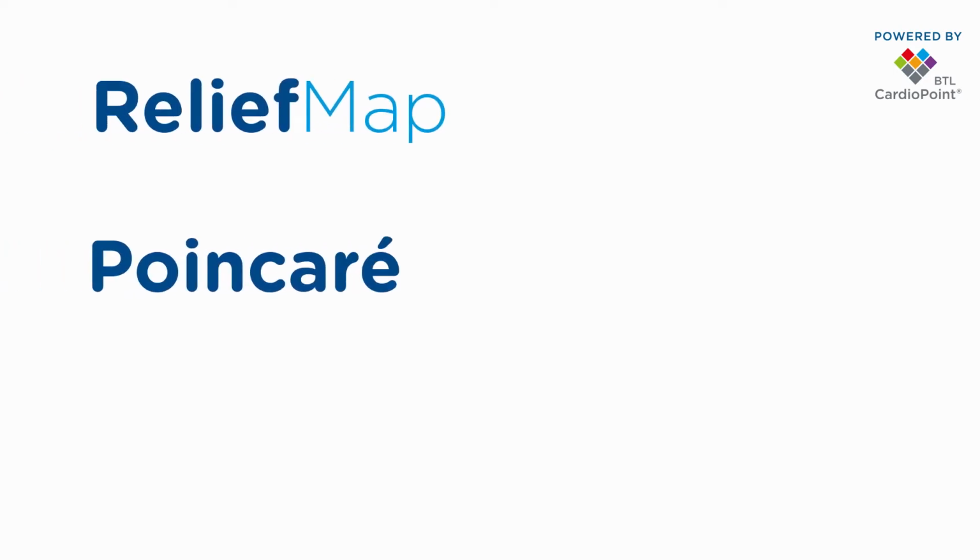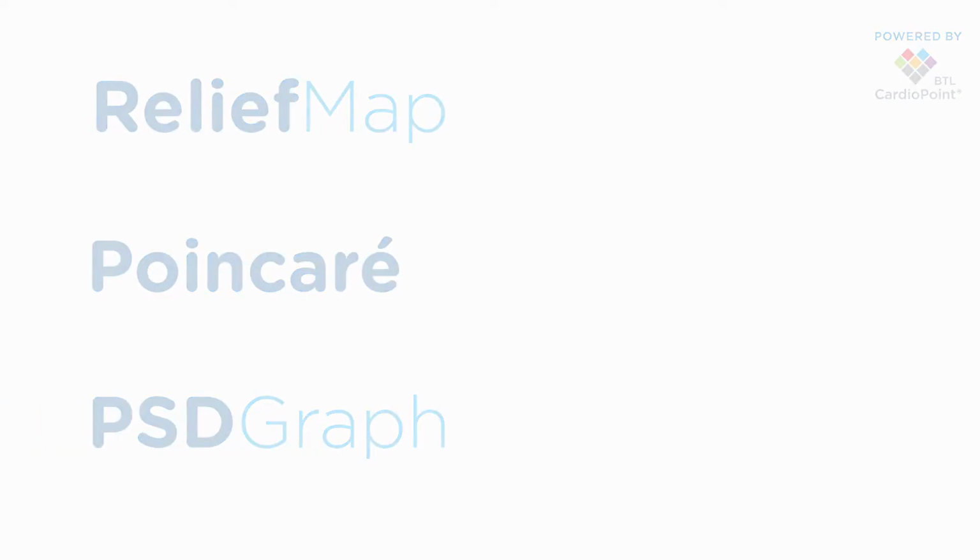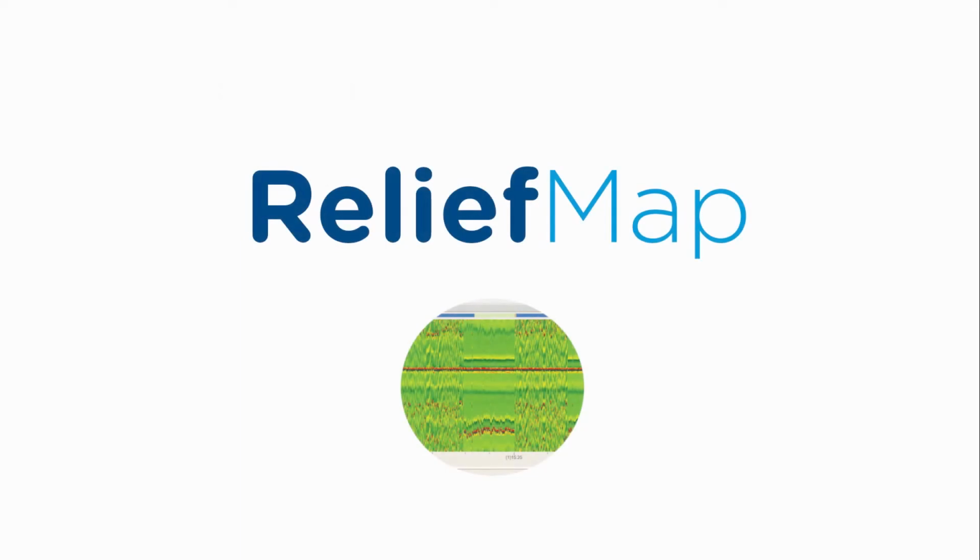So today, we will talk about 3 visual analysis tools: Relief Map, Poincare, and PSD Graph. Let's start with the Relief Map.